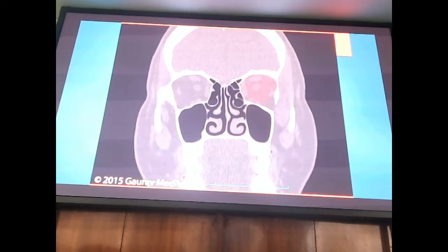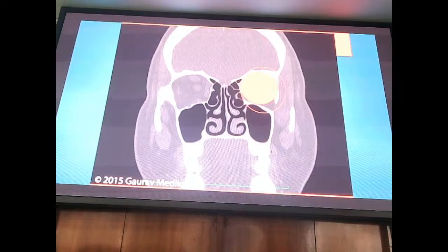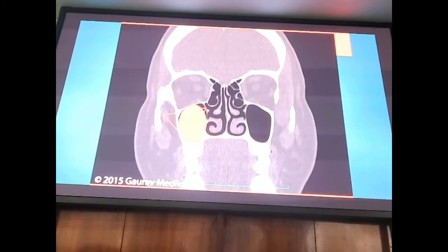As we keep going behind, I told you that at the point of the ethmoidal infundibulum, the orbit is more round in shape. See how big it was. This is the same size that I have left it from that time. See how big it was there, and now the orbit is becoming smaller in size, okay. And the maxillary sinus, which was triangular, is now becoming vertically oval because we are reaching the back end of the maxillary sinus. I told you to observe the level of the maxillary sinus in relation to the floor. There it was above. Here it is below the level of the floor.